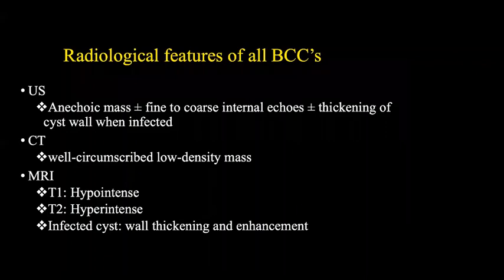There will be some thickening of the wall and some inflammatory changes if it is infected. The same for CT, well-defined, low density. It can have a little bit of enhancement of the wall, just a thin enhancement, but if there is more thickened enhancement or any inflammatory changes, that's in case of infection. And the same for MRI.